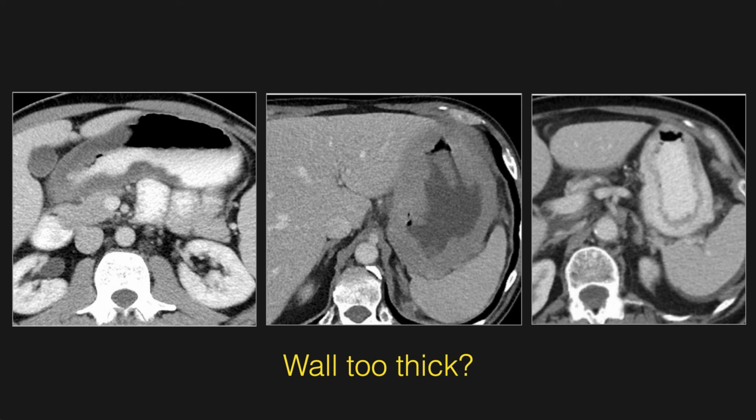So now that we've covered several inflammatory and infectious gastric pathologies, we're going to have to address the really bad actors in the bunch. It's time to talk about cancer. We'll start our conversation by going back to wall thickening and expanding our differential beyond inflammation alone. As you know, inflammation of the stomach wall is relatively dark, indicating edema.